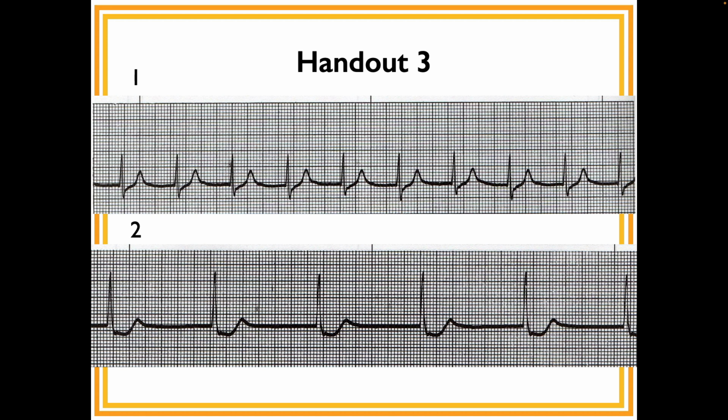So these are junctional rhythms? Well, you tell me. Well, but here's the deal. Most of them are, not all of them. There are some atrial, there's some sinus. Okay.